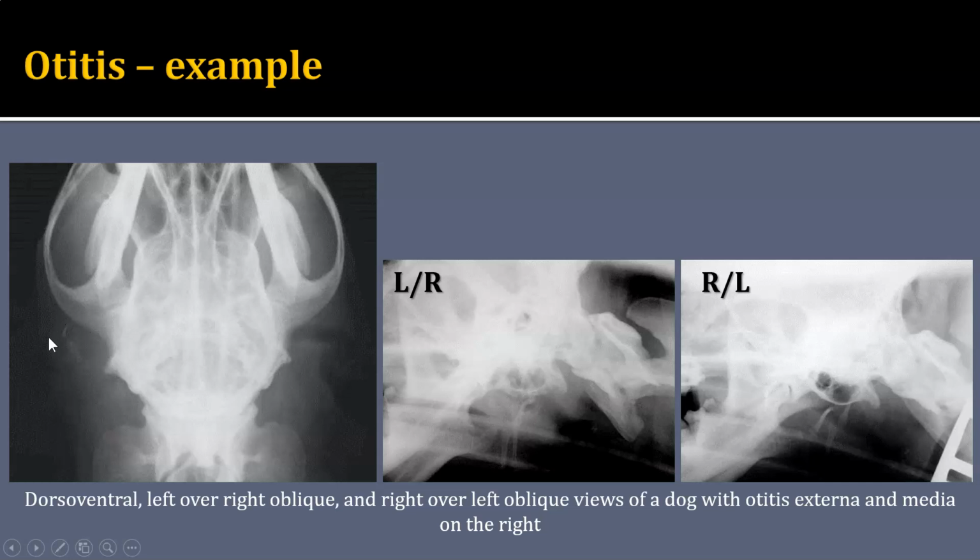Now, the one thing that concerns me a little bit about this kind of soft tissue lesion affecting the right ear canal with this oddly oriented dystrophic mineralization is whether or not there could actually be a mass here, which could be like a neoplastic mass. So he'll need further workup.